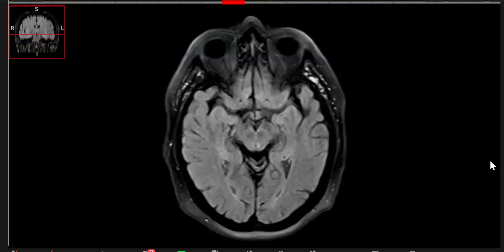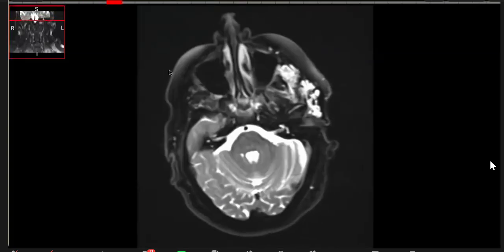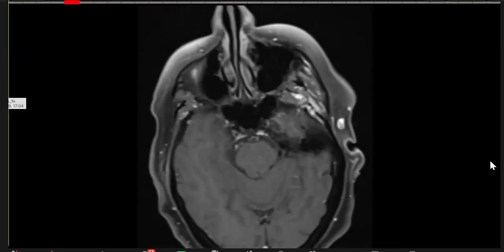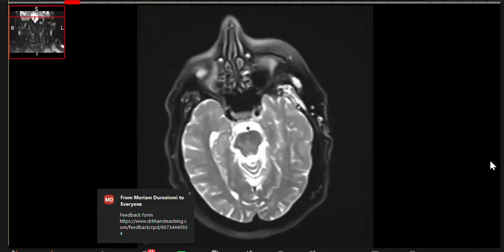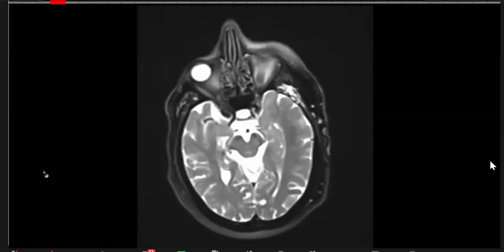So what it is, and so I would have then shown you this post contrast sequence here. This is just to make a point that this is on a STIR sequence. You can see how it is behaving, and then it is going again the same thing which we have already learned.